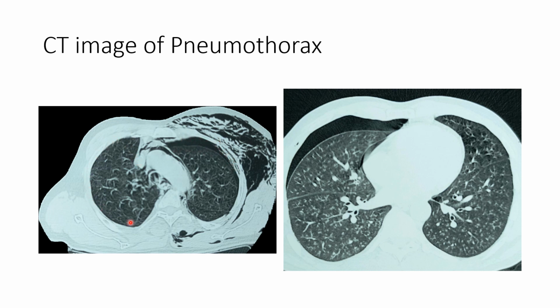See, this margin is clear. This is subcutaneous emphysema. It is in the soft tissue plane. So air is leaking here, here, here, here. Normally, especially in traumatic pneumothorax, you can encounter subcutaneous emphysema.